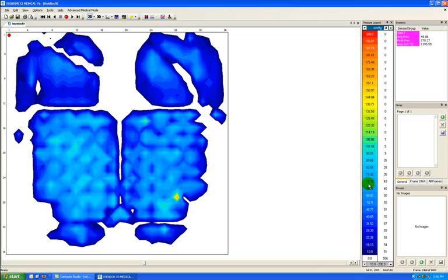Reading the pressure legend isn't as simple as blue is good and red is bad, since the scale can be changed to help you identify areas of peak pressure. Right now I can see that I have just a single point on my pressure image that would be of concern, that's showing either yellow or red. But if I turn the pressure scale down, that is, I decrease the peak threshold value, I can make the image look much different. So I'm going to click on 108.06 as an example.